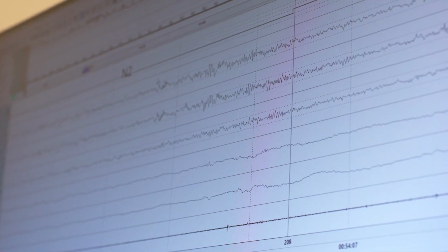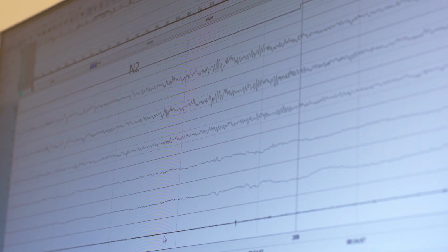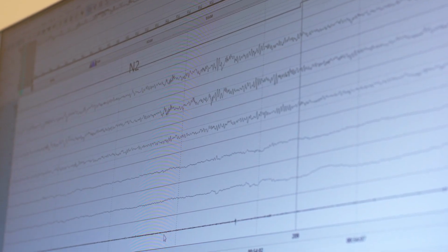We still see our theta frequency, but now increasingly with these grapho elements, the K complexes also include spindles. Spindles are small interspersions of, again, a very fast frequency, an alpha frequency, which we might also see in this patient now. In any case, these are signs of stable sleep, of sleep stage N2. We distinguish between non-REM and REM sleep, light sleep and deep sleep, and we are now in a stable light sleep state in N2.